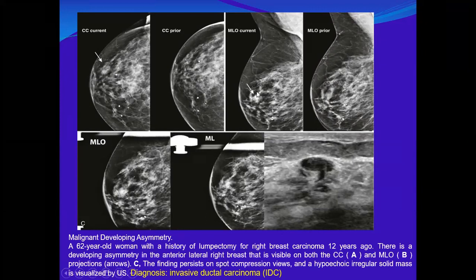And if you have seen the mammogram for the first time without comparing with the previous, you might pass it, yeah? Do you agree? Agree. Especially since it is a screening mammography. It's only screening mammography. So we just have to be aware of these pitfalls.